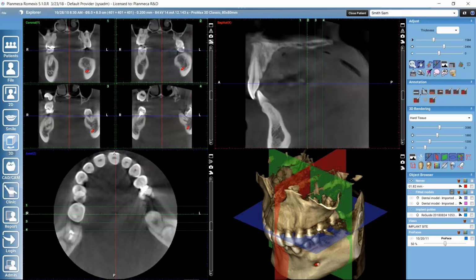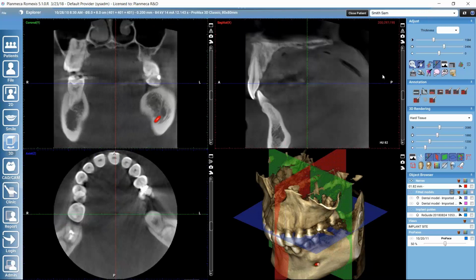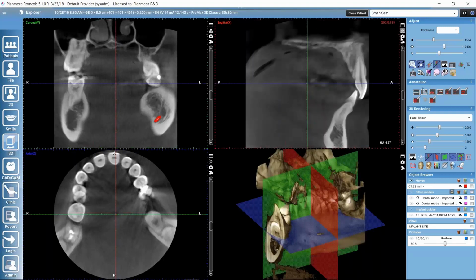We can also adjust what is the distance between the slices. If we open again the Viewport Settings here, we have a control for adjusting the distance between separate slices. So let's change this back to 1 slice. And also, if we would like to mirror the data, for example, if we would like to view this sagittal view mirrored, this other button here helps us. This mirrors the data.